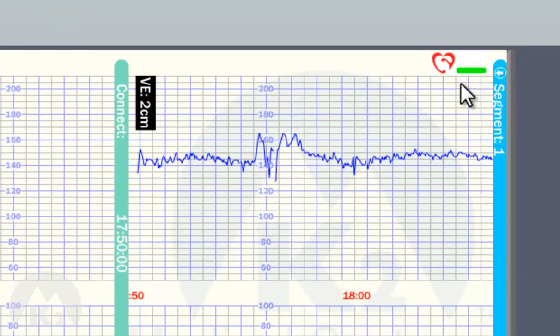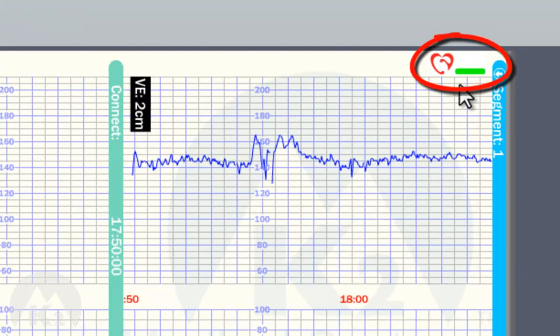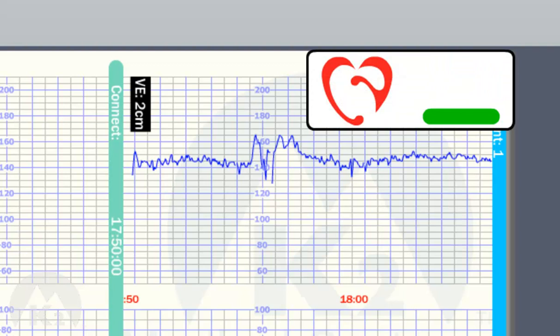Infant is a unique CTG interpretation system that reliably detects and alerts clinicians to early signs of potential fetal problems. Infant communicates its level of concern through a series of escalating concern states arranged into a colour-coded ladder. The colour-coded concern states are as follows. Green, no concerns.